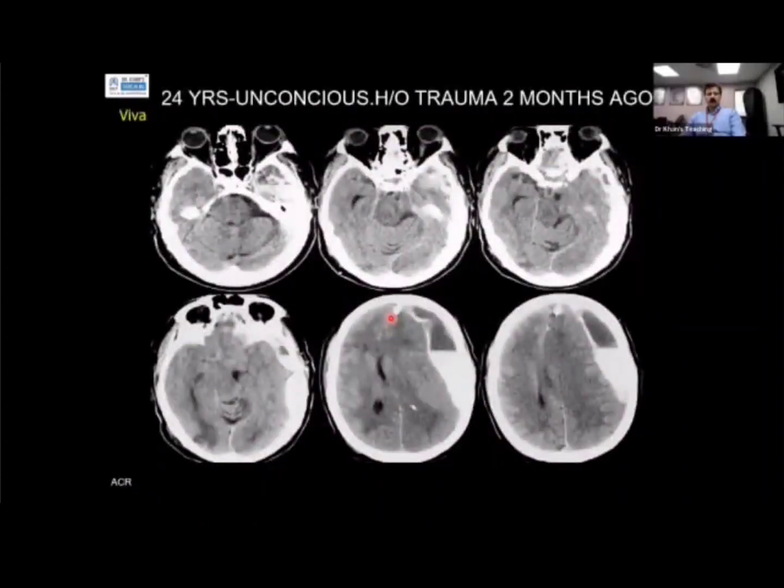So this is the last case of the day as far as the PowerPoint is concerned. Candidate 6, are you with us? Yes, I'm with you. Okay, so can you describe it, and then I'll show you a few DICOM cases.